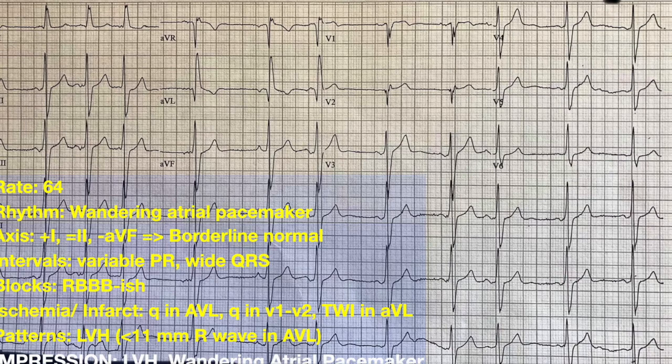Whatever has gone on with this person's heart, it's probably been long-standing, probably not anything that we are just noting for the first time today, most likely. That is our EKG of the week.